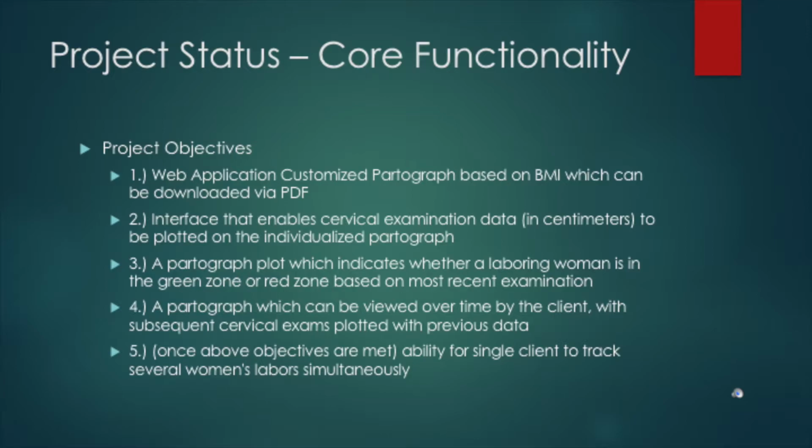Objective 3. Our web application clearly marks the green or safe zones and red or danger zones based upon the patient's progression through her delivery. Our graphing technology makes it clear when a patient's dilation measurement exists in a red zone. Objective 4. Our web application's partograph is specifically designed to enable subsequent cervical measurements to be entered alongside existing measurements.